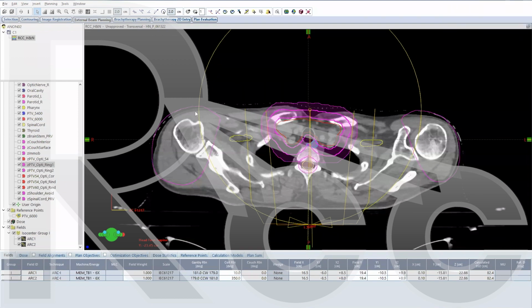And so on my previous tutorial on head and neck planning, which Senji is sharing with you, you will see how I've optimized without any sort of algorithm being able to do avoid entry. So I just put really hard constraints on the shoulders, and I was able to achieve it similarly. So if you're curious about that, you can watch that other video on YouTube. So in this case, I've just put shoulder avoidances. I'm going to use my optimization algorithm to avoid entry through the shoulder.